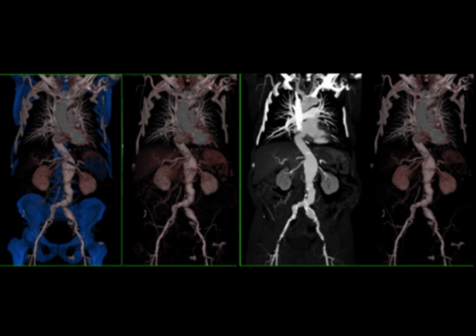In order to make certain we're looking and seeing if there's any change in aneurysm size. Of course, one of the challenges on the first exam you have is you're not really certain if the aneurysm is stable or it's growing. And that's why often shorter-term follow-up is done with the first sitting.